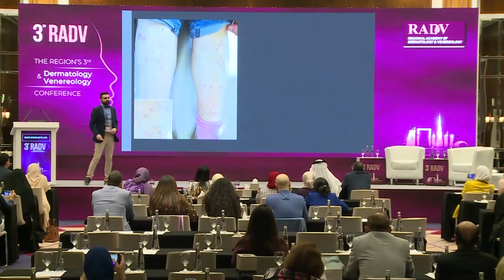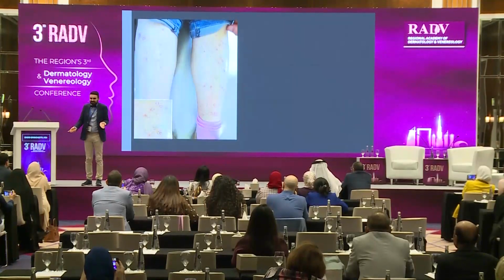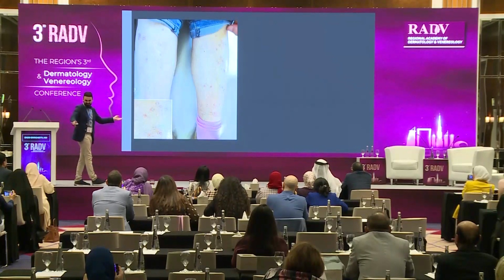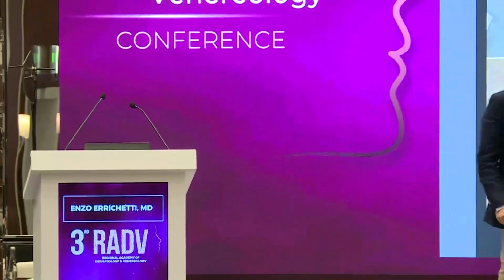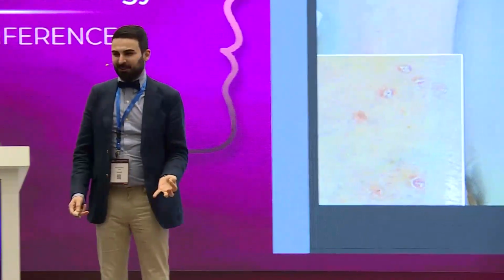Okay, this. Porokeratosis. Then? Pityriasis lichenoides. And sarcoidosis? No, it cannot be sarcoidosis, come on. No. It cannot be sarcoidosis. What do we have? We have orange areas, sarcoidosis, and small focused vessels. This was sarcoidosis. You always have to say sarcoidosis.